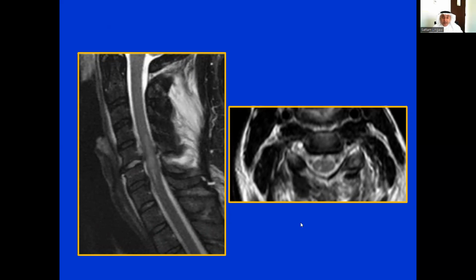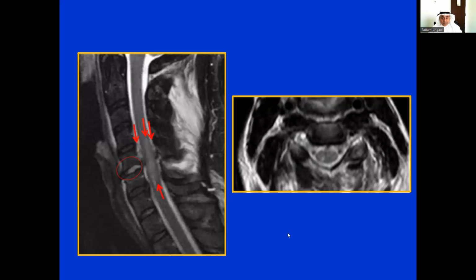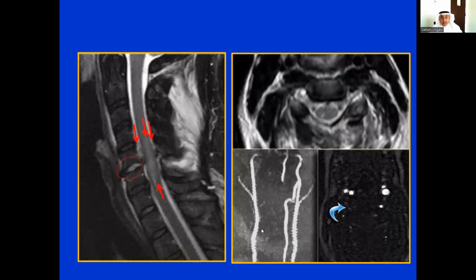This is a ruptured disc associated with the hematoma and the compressed and contused spinal cord with intraspinal edema. What might be missed, obviously there's a large hematoma in the paraspinal muscles and the disruption of the interspinous ligament. However, what could be missed in a long night on call are other subtle findings, such as the abnormal signal intensity in the vertebral artery, indicative of thrombosis, and the abnormal signal intensity in the posterior column of the spinal cord, indicative of spinal infarction, as confirmed with the vertebral artery thrombosis in here.